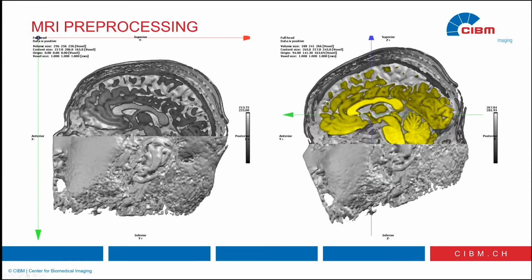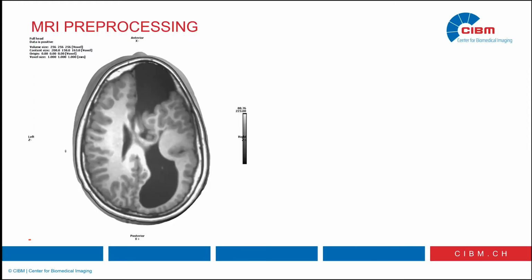There is the mid-sagittal plane realigned, the MNI transverse plane, and it has nicely found the AC, the anterior commissure, and put the origin right here. So we are in a pseudo MNI space here. We're still in the patient space, but we are realigned like the MNI. So that's real life. It was very, very difficult to have the toolbox work on that. That's another patient.